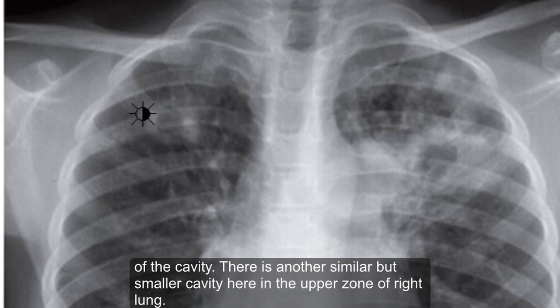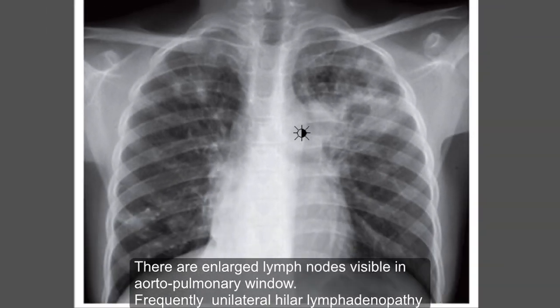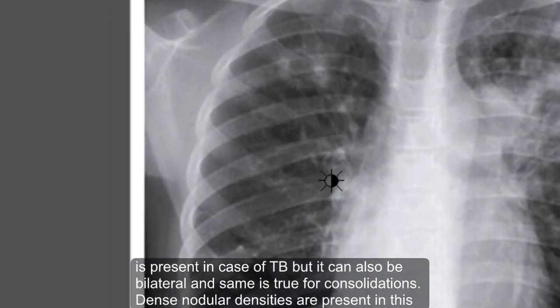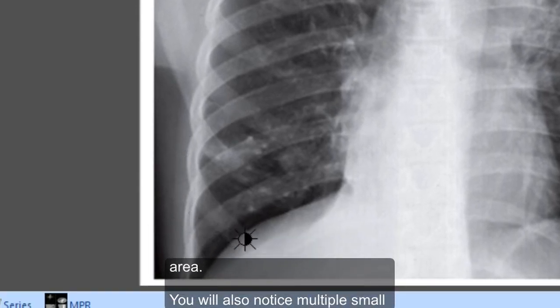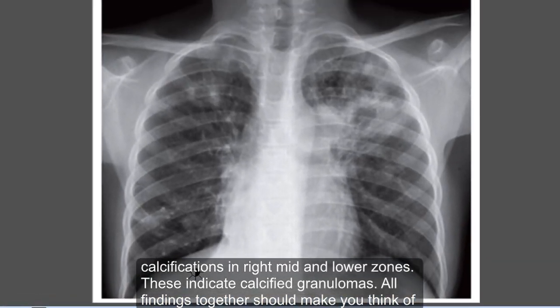There is another but a smaller cavity in upper zone of right lung. There are enlarged lymph nodes visible in aortopulmonary window. Frequently unilateral hilar lymphadenopathy is present in case of TB, but it can also be bilateral, and same is true for consolidations. Dense nodular densities are present in this area. You'll also notice multiple small calcifications in right mid and lower zones. These indicate calcified granulomas. All findings together should make you think of TB.